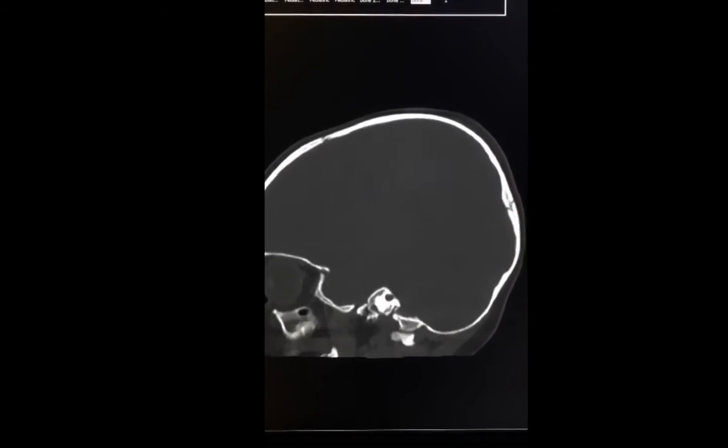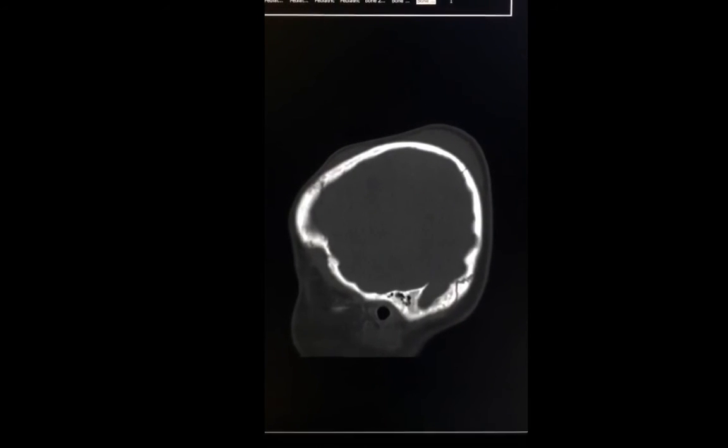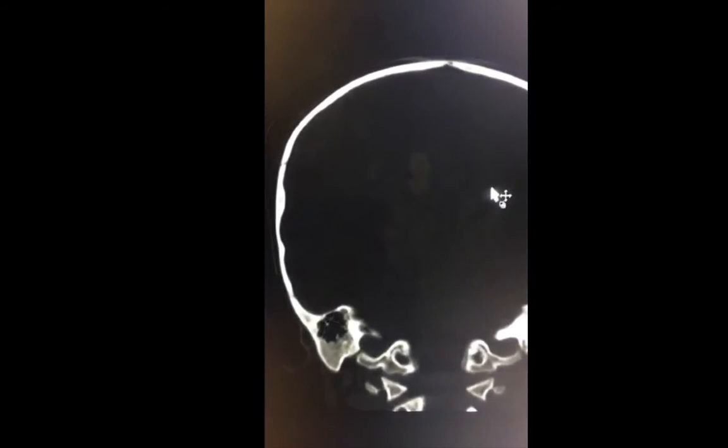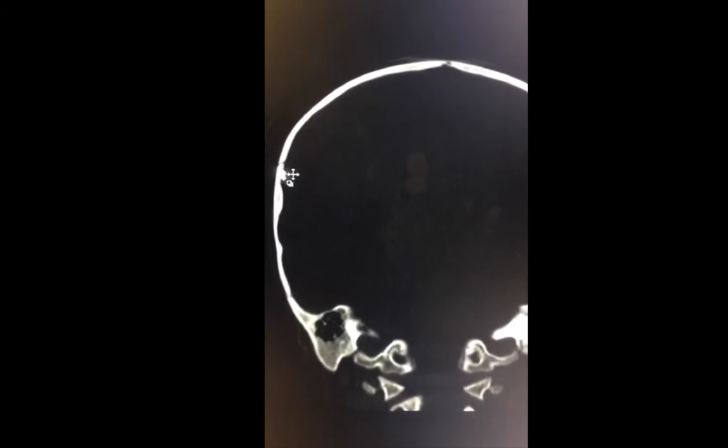Remember how the fracture line was difficult to detect? It's much easier to detect such abnormalities utilizing the sagittal and coronal reformats. On this sagittal image, you'll notice the zigzaggy and normally located lambdoid suture with another line that's not normal here. This is the fracture line that we detected earlier, which is much easier to see on the sagittal image. It's even easier to see on this coronal image. Notice that you have an extra line here that is not present on the other side, consistent with the fracture.